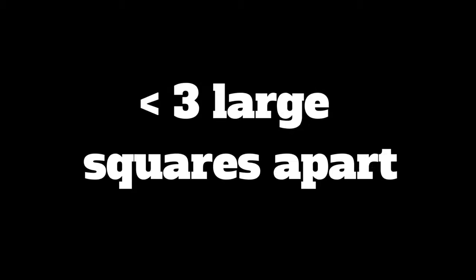Remember, during an emergency, you would probably not be able to find a calculator and a ruler, but your brain is always with you. Before I give you two more ECGs for practice, can you repeat the names of those 6 squares? 300, 150, 100, 75, 60, 50. Call Dr. Sutton if the R waves are less than 3 squares apart or more than 5.